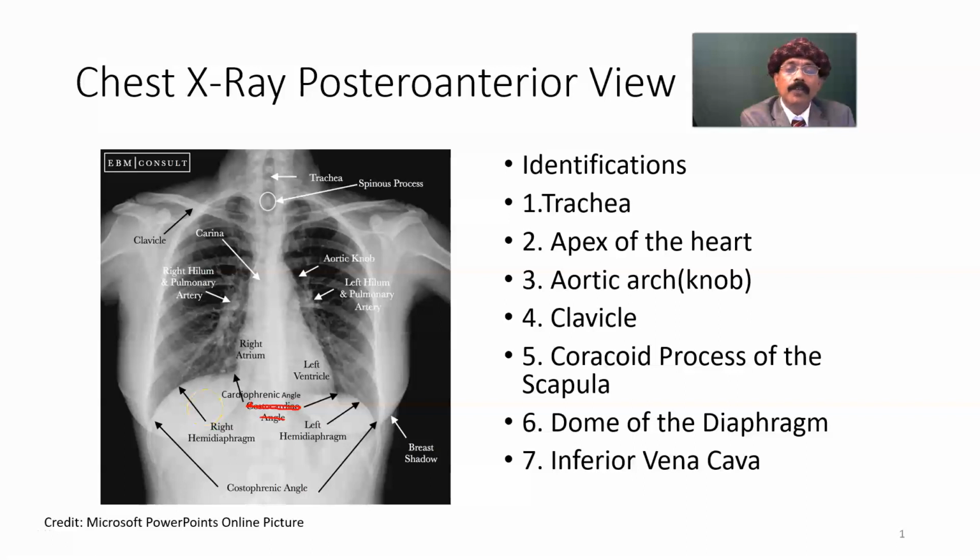Hello, my name is Dr. Dewan S. Raja. Today I will discuss the chest X-ray, posteroanterior view, how to identify its structures, and also compare the normal chest X-ray with that of some diseased conditions. Let's get the identification of the normal chest X-ray.